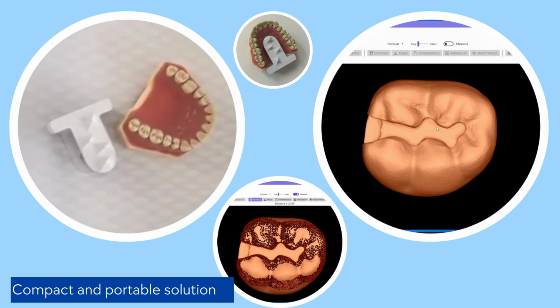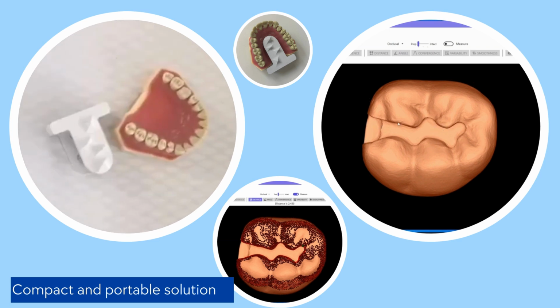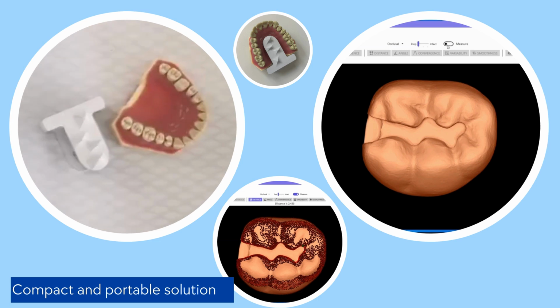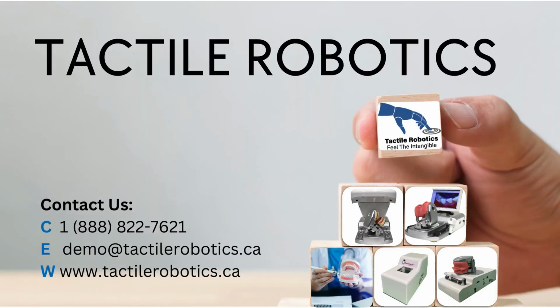This compact and portable solution eliminates the need for traditional measuring tools, and you won't need to make another hardware investment if you already have intraoral scanners in your preclinic labs. If you do not have an intraoral scanner, please contact us to explore our PrepScanner hardware options.